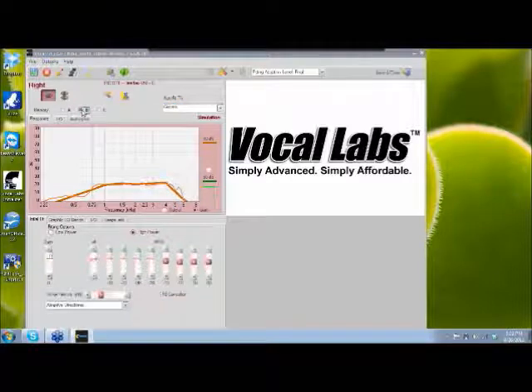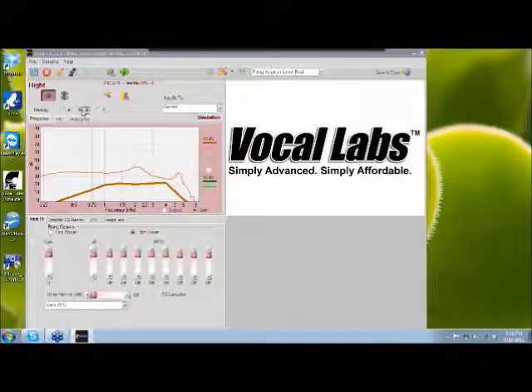So now we're going to go into our second memory. And maybe this memory is definitely a noisy memory, okay, for a noisy environment. We've already got everything else set, so we go down here to our input mode. And maybe we want to set this up for a fixed directional as opposed to adaptive directional. Adaptive directionality being the hearing aid will actually sense when it's more beneficial for the patient to be in directional mode, and it will automatically adjust into directional mode for the patient, okay?